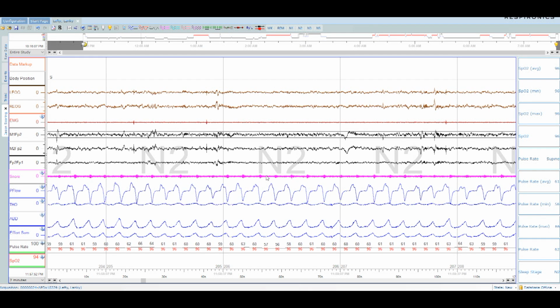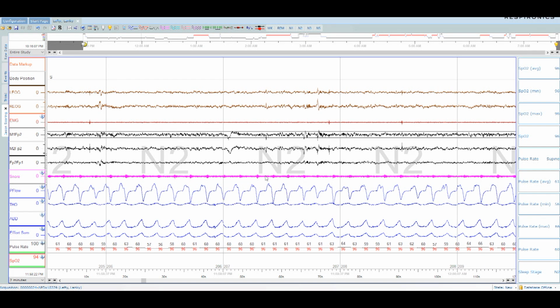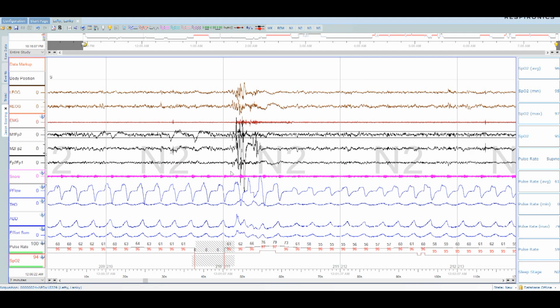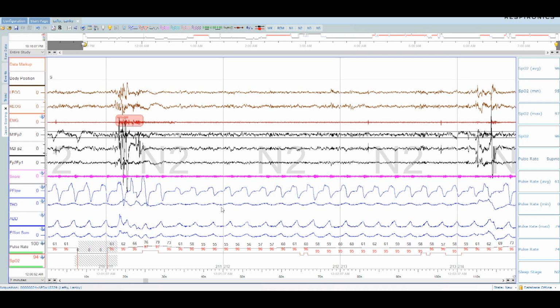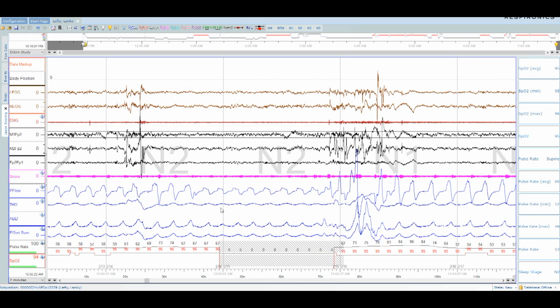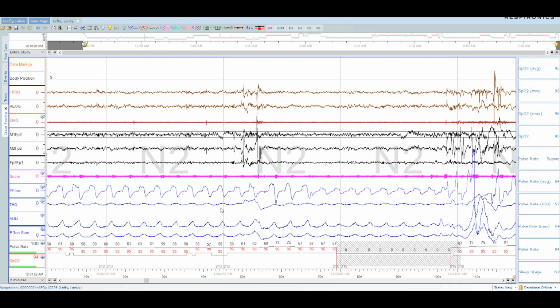Now, I, in my infinite wisdom, I say that tongue in cheek, recognize, yeah, I actually did wake up right there. So why not call it an arousal? Because I woke up. A lot of arousals. I don't see any decrease in airflow. Nothing going on there. It looks like the blood oxygen dropped out here because who knows? It does that sometimes. Quick editing note. Oftentimes when you have these unexplained arousals, you put them on CPAP, all of a sudden they go away. Even though these aren't technically RERAs at all, you put them on CPAP, it goes away. Interesting fact.